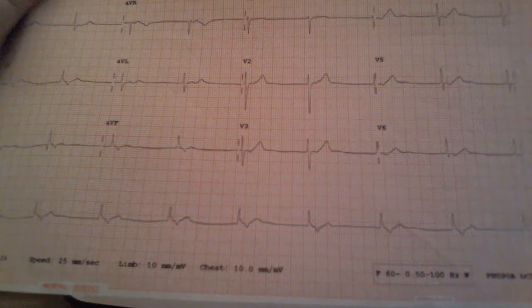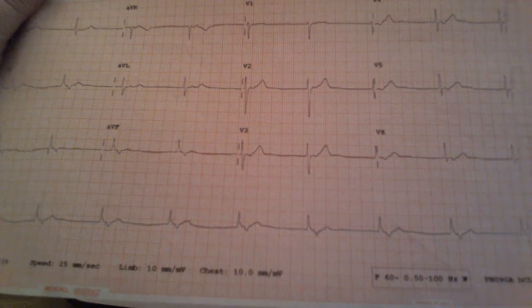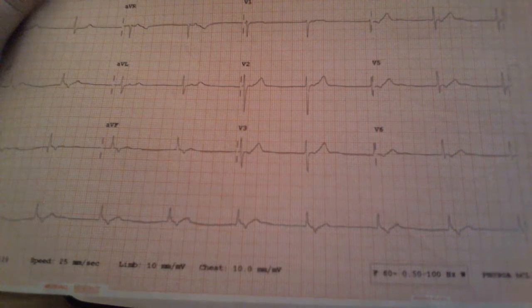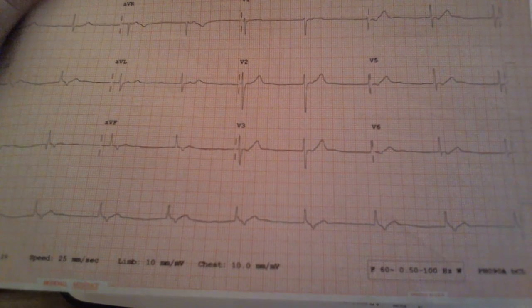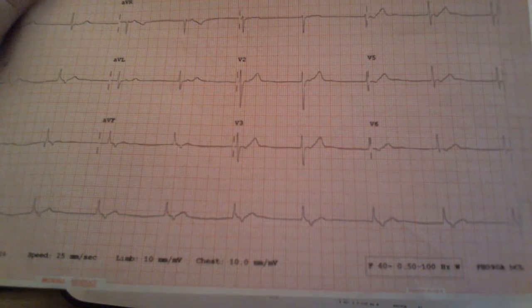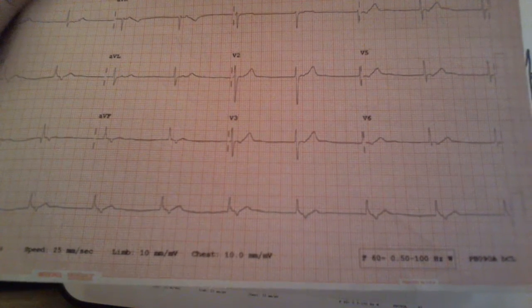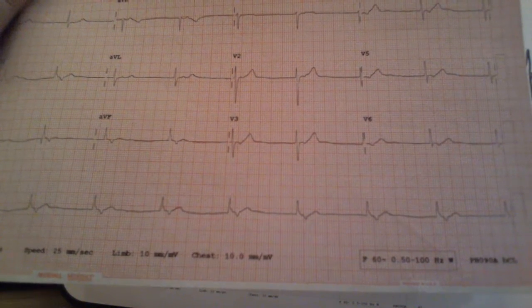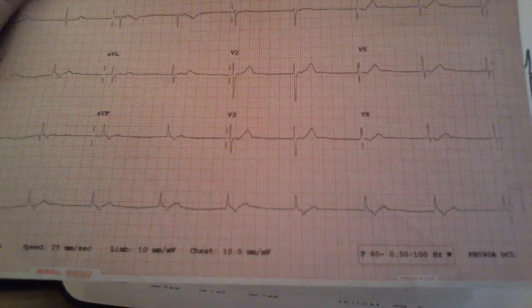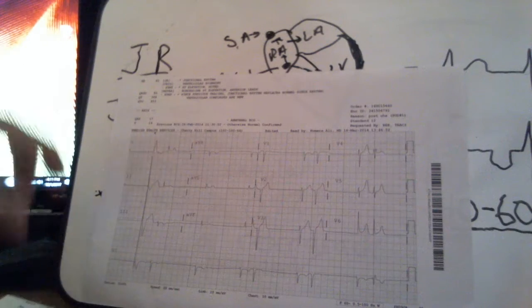It's not fat because this rhythm is originating in the atria. And atrial rhythms always have a thin QRS, equal to or less than 0.12. So that's what a junctional rhythm would look like on a 12 lead. And again, you would use your 300, 150, 100, 75, 60, 50, 40 to determine the rate. Junctional rhythm 40 to 60.